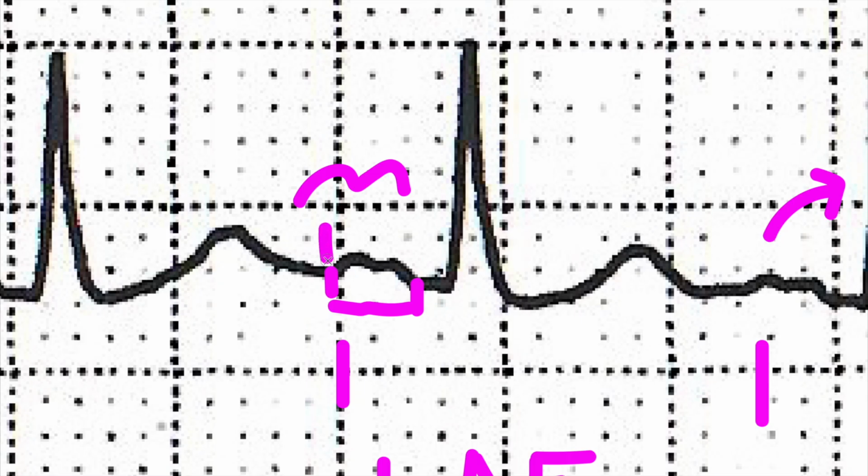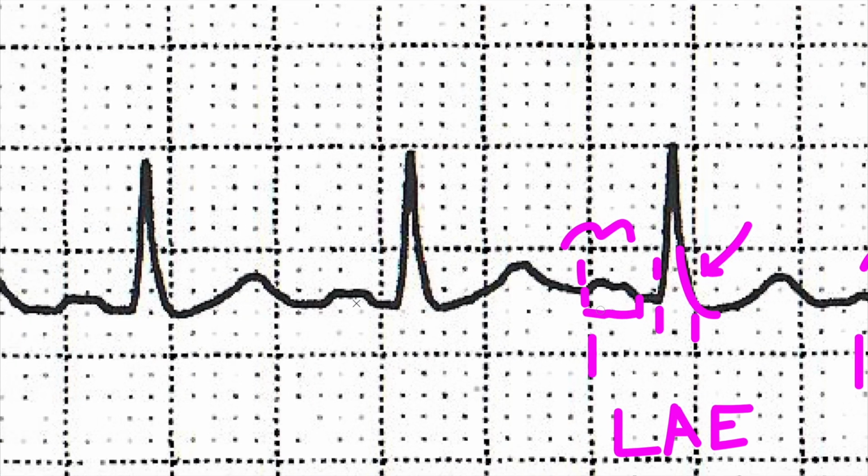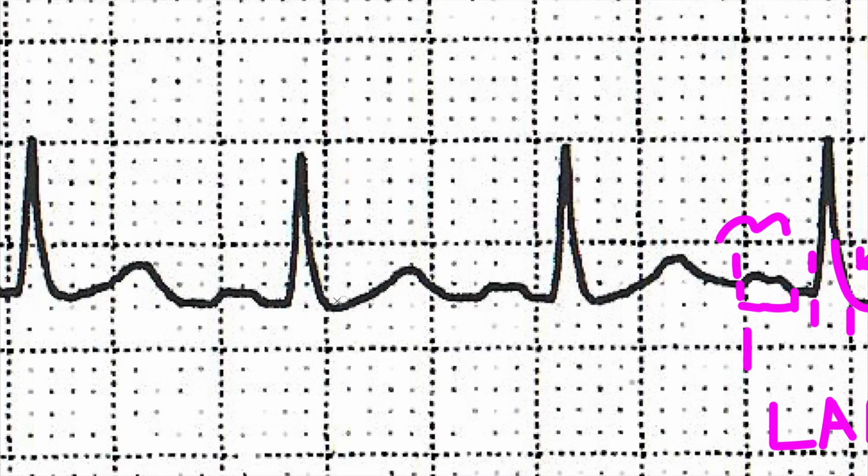While I'm down here, let's see this, the PR interval seems to be 1, 2, 3, a little over 3.5 boxes long, so there's no conduction delay, there's no first degree heart block. The QRS itself, it has this kind of swoop. See this down here? That's kind of interesting. I'm going to be taking a closer look at that later on. The QRS itself is roughly 2 boxes long, maybe a little bit bigger, so 80, 90 milliseconds. Just a quick gauge over here. QRS, ST segment, T wave seems to be fine.